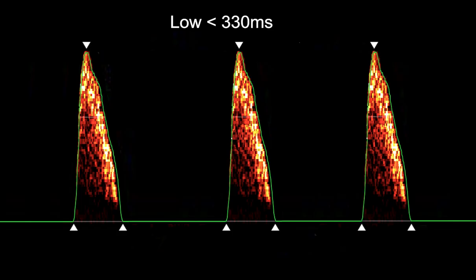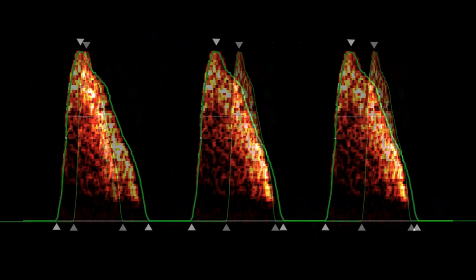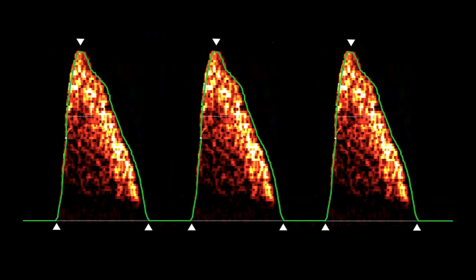If the FTC doesn't increase after a fluid challenge, you should consider other causes of vasoconstriction, such as excess vasopressors or hypothermia. A long FTC, i.e., greater than 360 milliseconds, is seen in conditions associated with a low afterload, e.g. sepsis or anesthetic drugs.